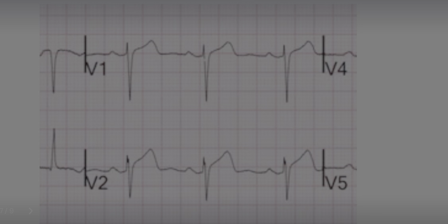So what is a hyperacute T wave? A hyperacute T wave is a T wave with an amplitude more than that of the corresponding QRS complex. These hyperacute T waves are a typical example of STEMI equivalence. So if you see a hyperacute T wave, you should be suspicious of a STEMI. These are the hyperacute T waves that we usually miss in our ED.